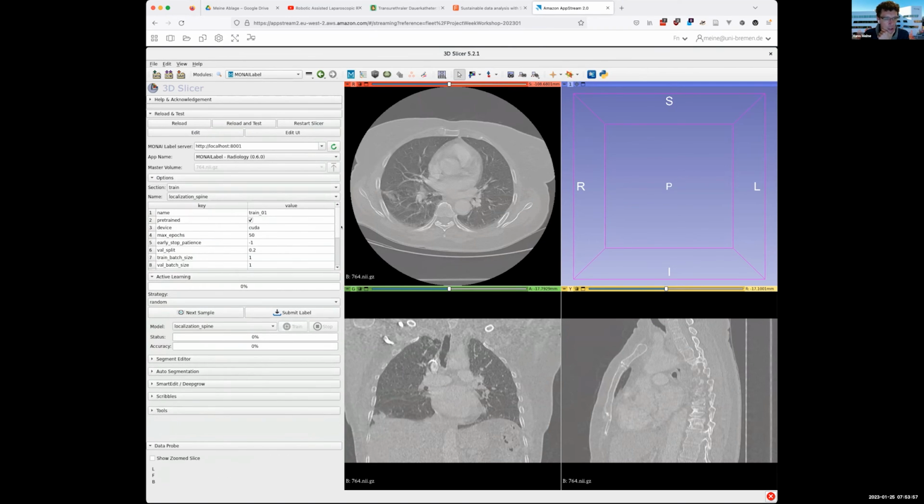Okay, yes. So you see the number of epochs. You see the percentage that is going to be used for validation, and whether you are going to use multi-GPU if you have more than one GPU. And also we use MLflow to track the training and validation. So that's the bit. I agree, something like advanced settings will be easier. We always try to reduce the number of buttons that people will use, but that's a really good point. Anyway, so this is the bit.